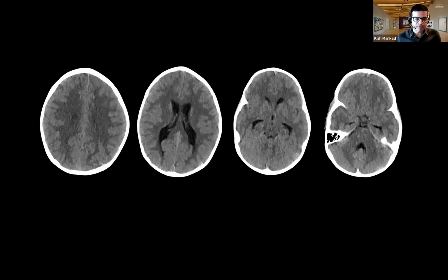So it has a lot of added value also in terms of picking up fractures and things like that. Also, acute blood products. But the most important thing is trying to understand how, in the urgent setting, you can get the most out of your CT scans, particularly when you do not know whether it is going to be normal, abnormal, or safe to proceed to a lumbar puncture, for instance. So let me see if this makes a little bit of sense to you all.